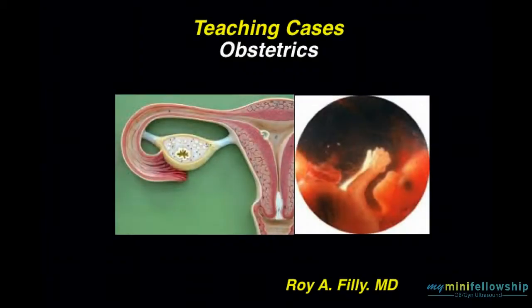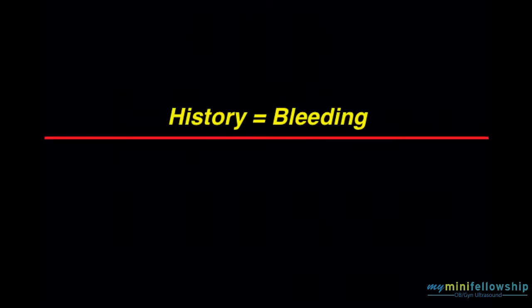Okay, we're going to look at a teaching case here in the field of obstetrics. The patient presented with bleeding. I'll give you a chance to look through the images and you can make your conclusion.